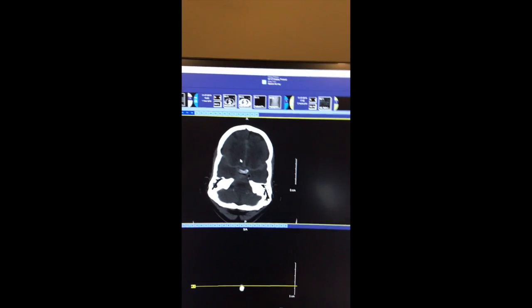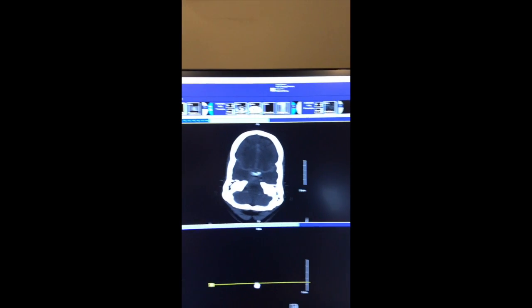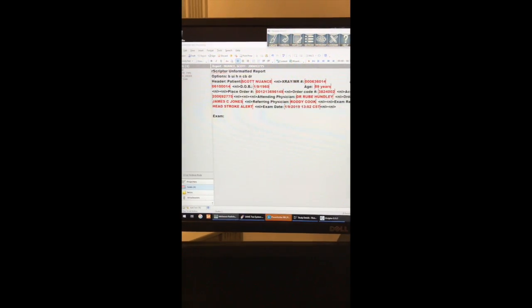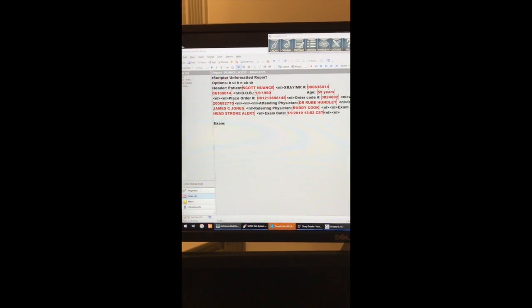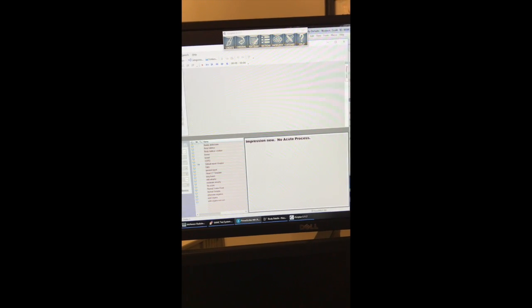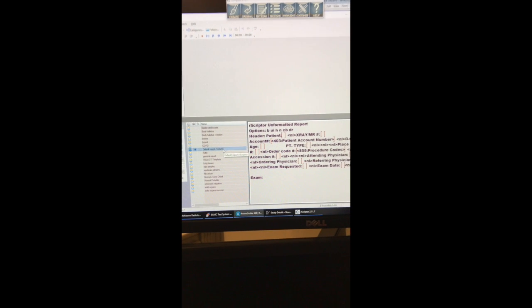Okay, so I've got a study here, and I'm going to notify it to PowerScribe. That's like sending to dictation, and that gets it over here into the PowerScribe window. Because my rScriptor general report is my default template in AutoText, in my regular folder, see that little arrow guy? Default report rScriptor is my default report, so it popped up that way.